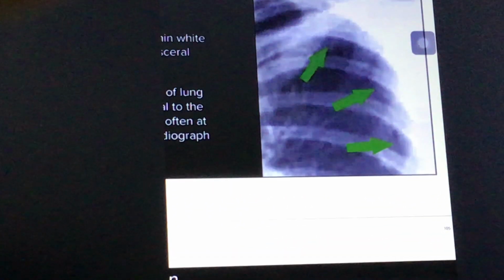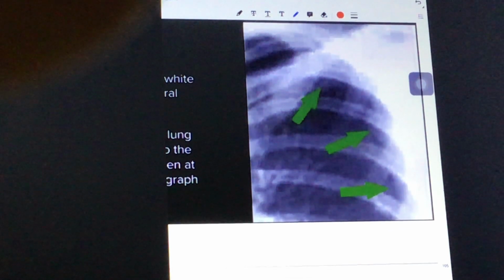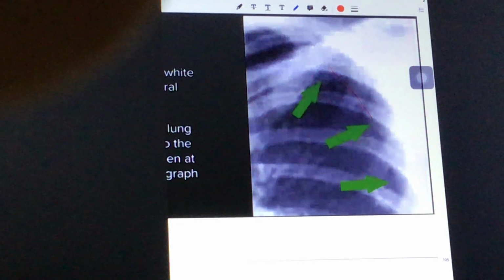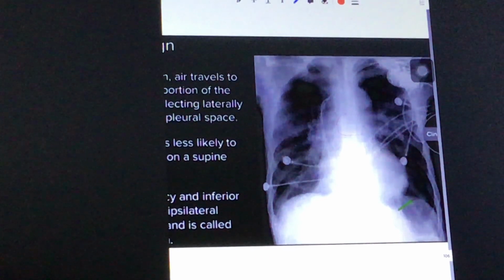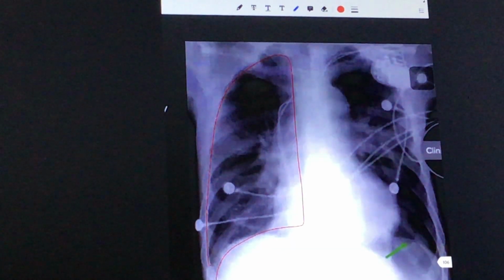This is lung which has still air inside compared to the left side. In the left side, you will see that it's totally in between the ribs in the lower lung, left lower lobe. There is already too much black here.